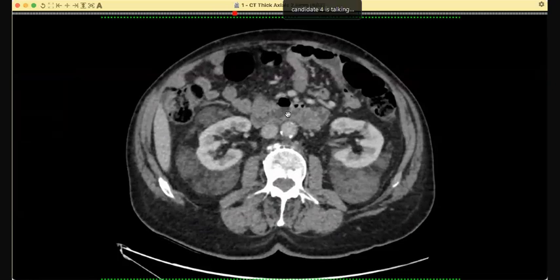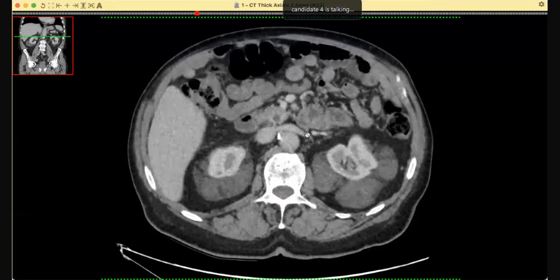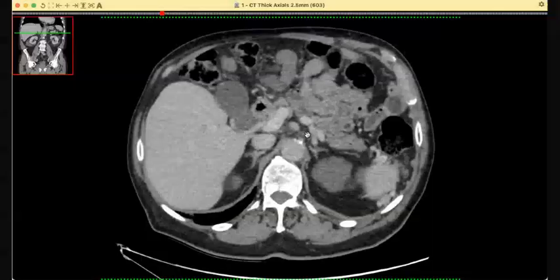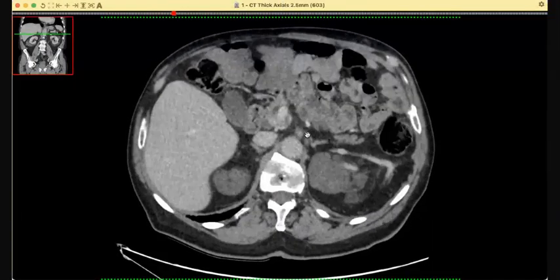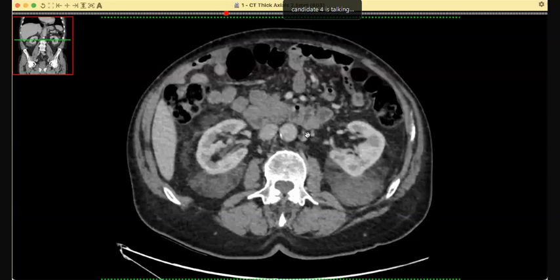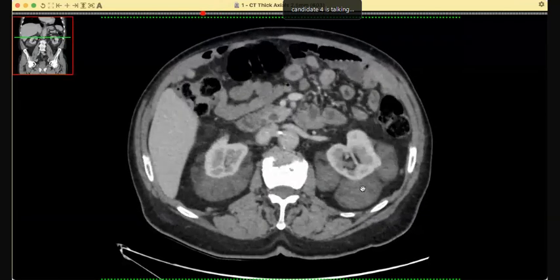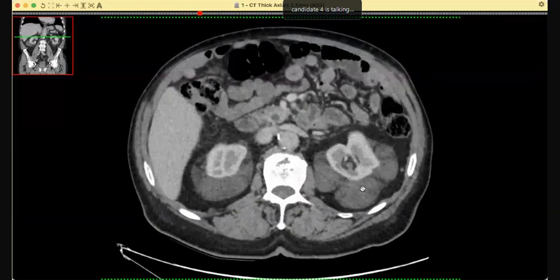So to conclude, these could be angiomyolipomas or perirenal collections. Also, I'm keeping a differential of lymphomas. However, the renal parenchyma appears normal. This could also be a spontaneous hemorrhage involving both kidneys, which is limited by the perirenal fascia.